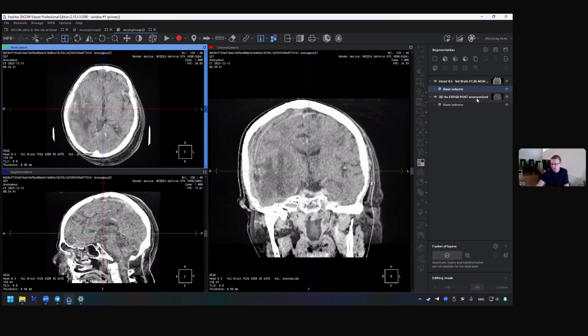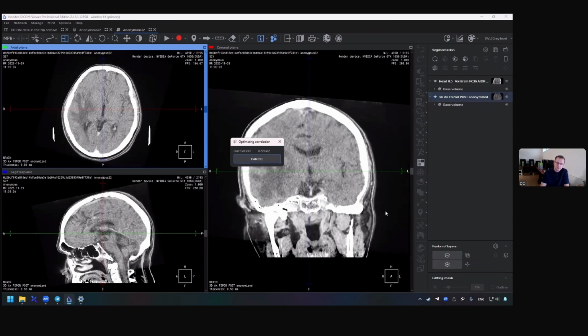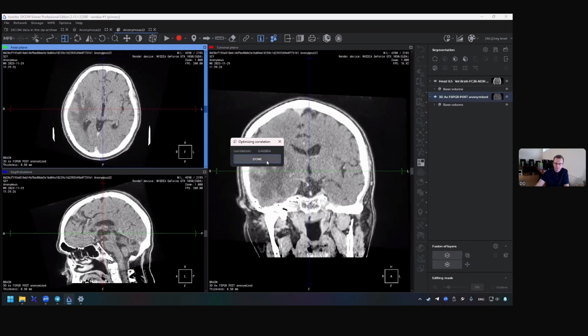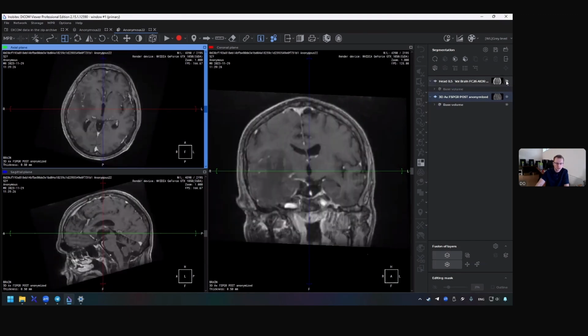And here in Inobitec, we have different types of alignment, different types of layer fusion. With points, manual alignment, or in most cases, we just need to press one button, merge layers automatically. And after some correlation, we will have two well co-registered studies in one tab. Done. Okay, MRI and CT, CT and MRI.